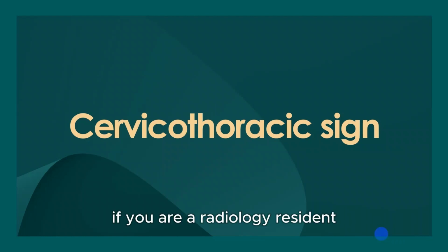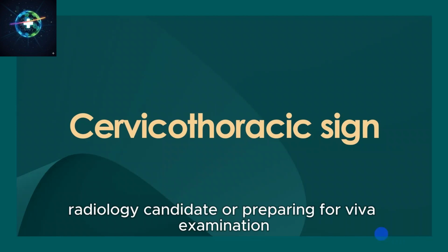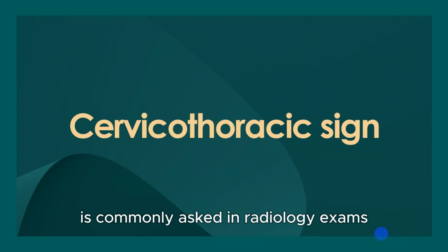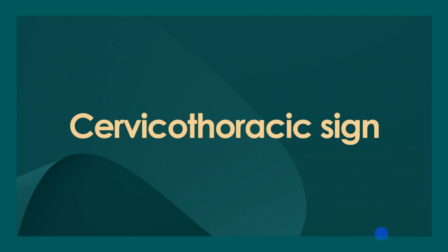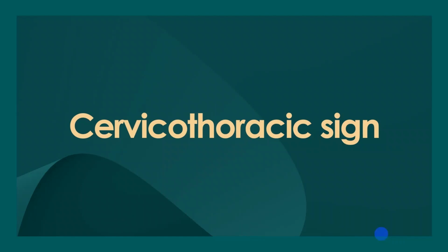If you are a radiology resident, medical student, FCPS trainee, MD Radiology candidate, or preparing for Viva examination, this is a must-know topic because the cervicothoracic sign is commonly asked in radiology exams and clinical discussions. So first, what is the cervicothoracic sign?